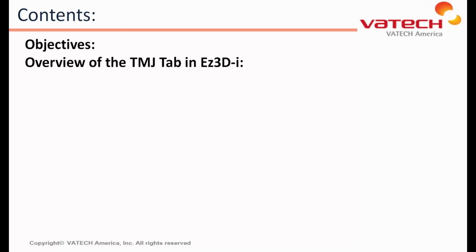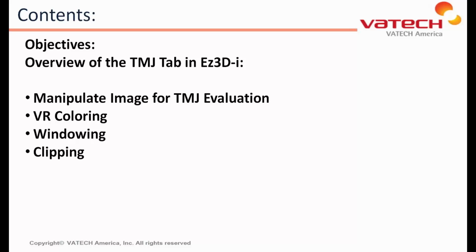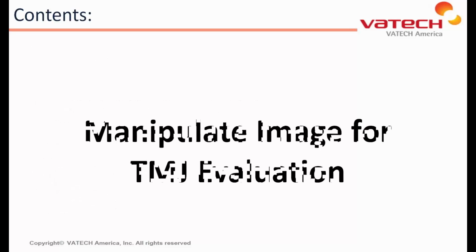Objectives of this session are to manipulate image for TMJ evaluation, VR coloring, windowing, clipping, TMJ to define area feature, change layout, and default toolbar. First section, manipulate image for TMJ evaluation.